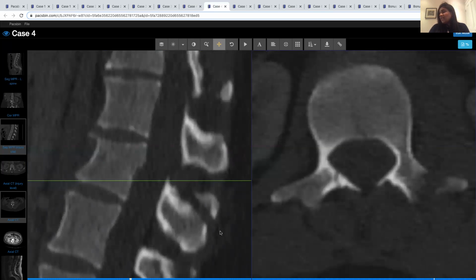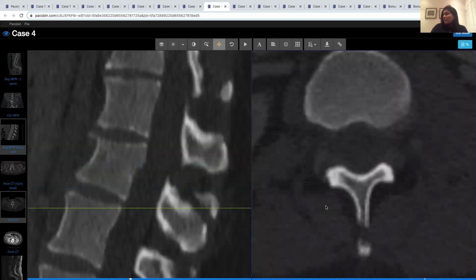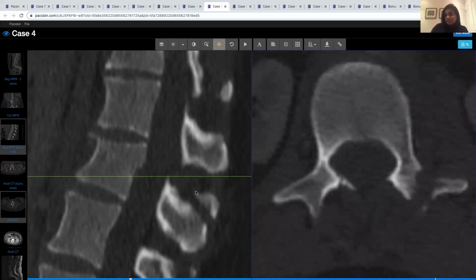So you can see here that this is a horizontally orientated fracture that transects through that spinous process. The line of the injury, where it's come out, is going to involve that interspinous ligament almost certainly, through the flavum at this level. And look at the line of injury continuing along in that vertebral body where you've got a compression fracture as well. And you can see on the axial here, we can see the laminar crack, so you can see the spinous process fracture, the laminar involvement. So there's likely to be also a flaval injury as well.